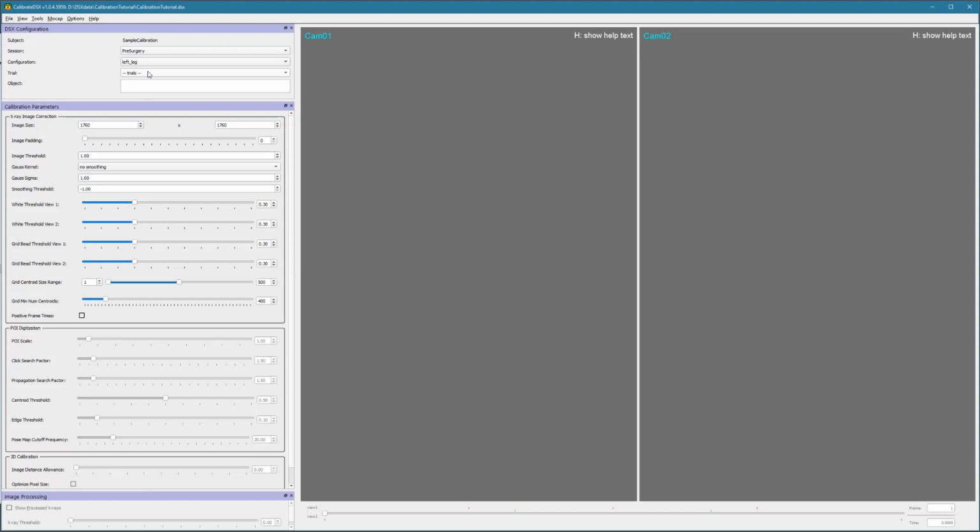In any case, the final dimensions of the corrected images must be specified at the start of the correction process, because all of the images in both calibration trials and motion trials must have the same dimensions. For this tutorial, we'll reduce the resolution by a factor of 2, so we'll enter 880 for both the X and Y dimensions.